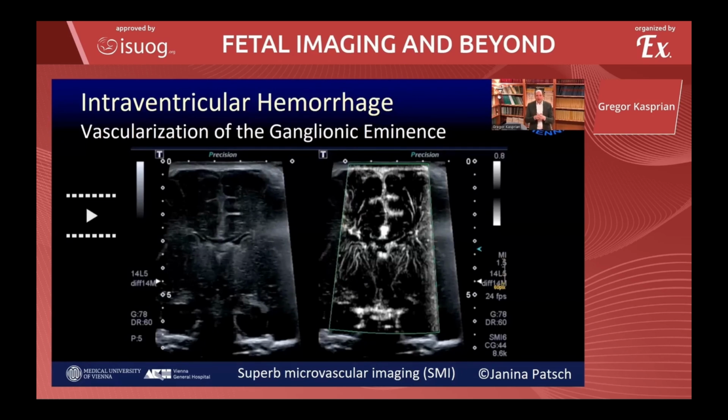What is the peculiar thing about this structure? The peculiar thing is that, and these are images done by my wife, who is a pediatric radiologist. So you see, I'm not only into MR, there's a big interest on ultrasound on my side as well. And I see the fascinating developments here.